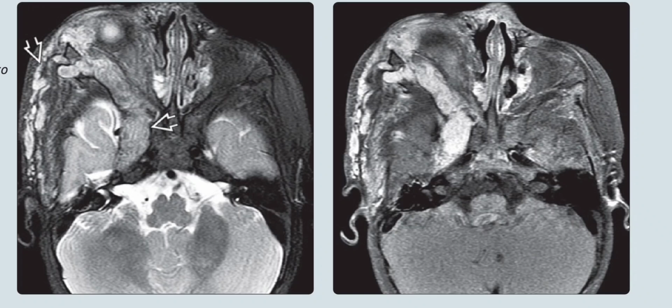Right is the T1 contrast enhanced FS scan in the same patient, and it shows the plexiform neurofibroma, which is enhancing really strongly and mildly heterogeneously.